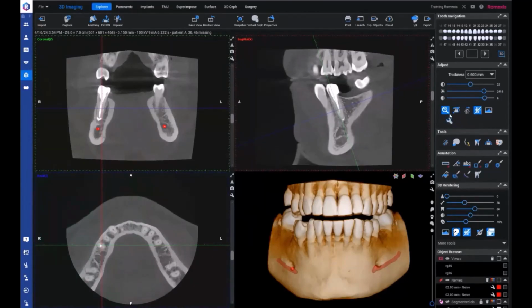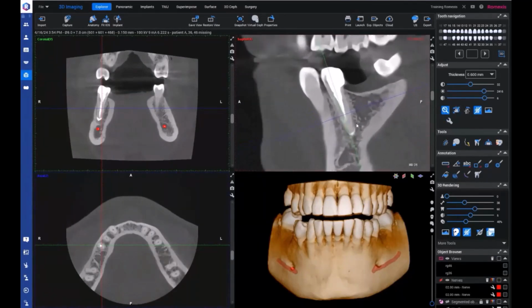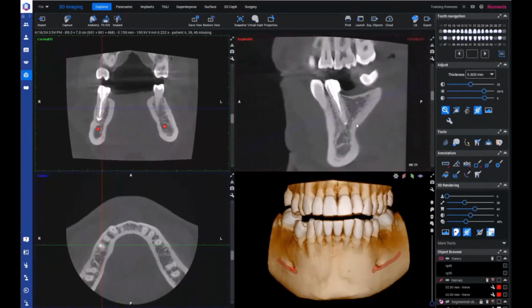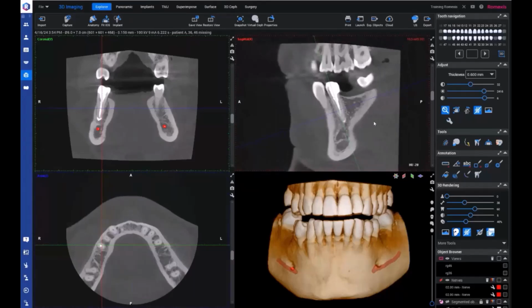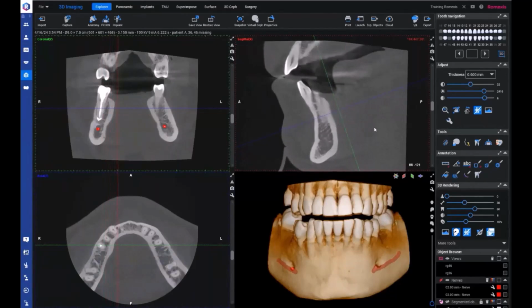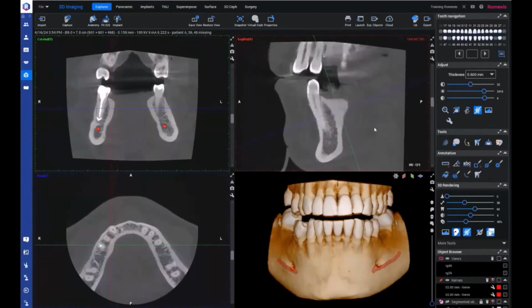Another big thing to know is also this zooming and/or slicing in the views. So now, for example, when I have this enabled by default, when I use the mouse scroll wheel, I'm zooming in the volume. But if I deactivate this, then the mouse scroll wheel moves in the slices. So if you want to go little by little, it's very nice and easy with this mouse scroll wheel. You can, of course, do it also here from these sliders.